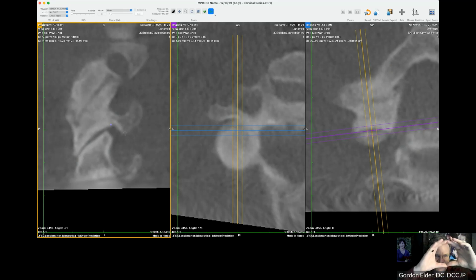It's different when we go posterior. If it had gone posterior on the left, the whole neural canal would have rotated down and to the right. So we call that a PRI. Confusing in the beginning, it makes sense later if you think about how the neural canal moves, but it's always been kind of a source of irritation to me that it's not named for the joint that's misaligned. Okay, so that's how we analyze C2.